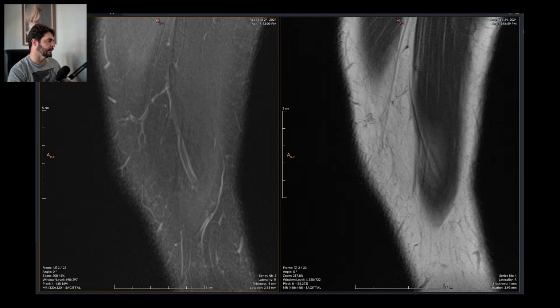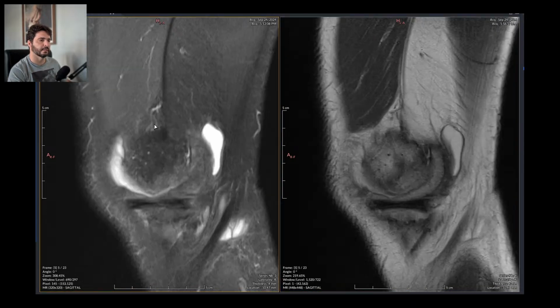No sensitive data showing. And right there. So this is a right knee, a male patient, 59 years old, and it says there is arthrosis and free bodies inside the knee. So this can't be good. This is probably a completely screwed over knee, as always.